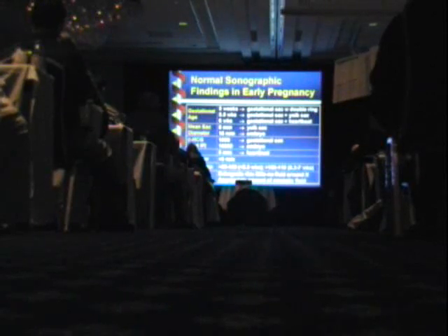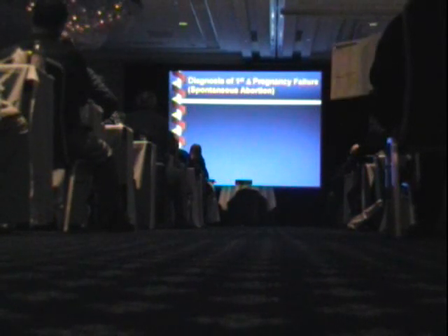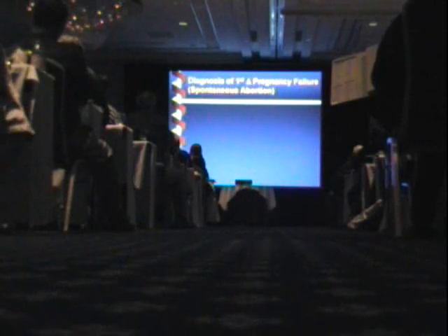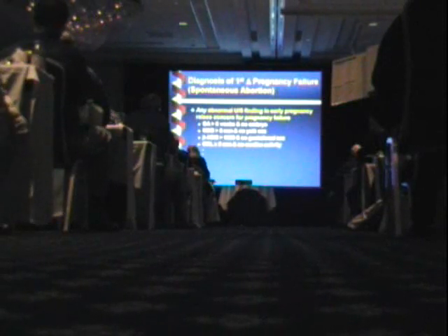How do you use it? Well, if you're doing a scan and you see the appropriate things, you're relieved. If you don't see them, you should be worried. But the key point is how worried to be. When do you use problems with these findings to diagnose first trimester pregnancy failure, a term that I think is preferable to spontaneous abortion? Well, any abnormal ultrasound finding in early pregnancy at least raises the concern for pregnancy failure.